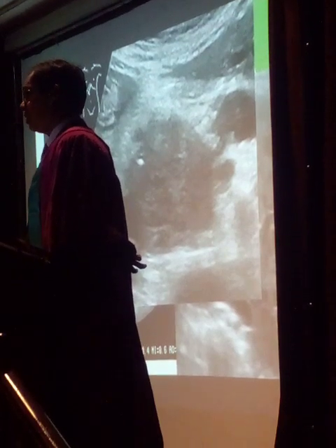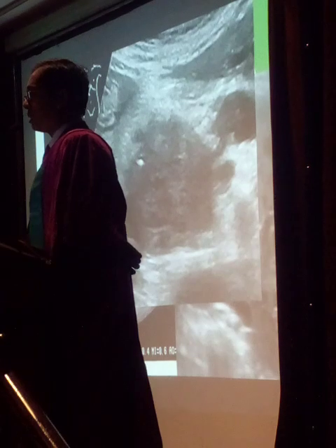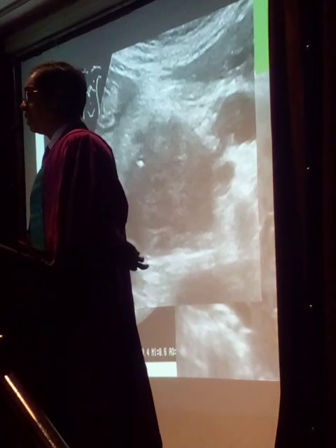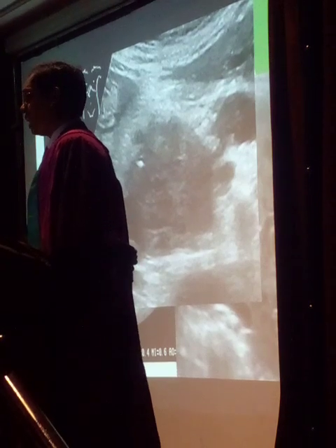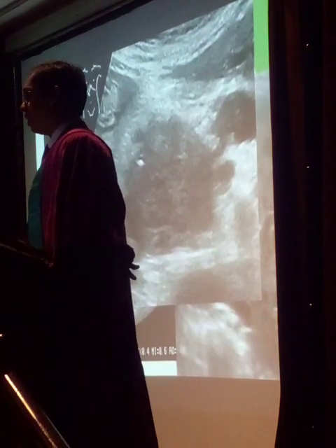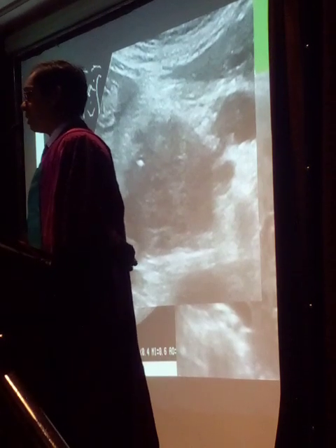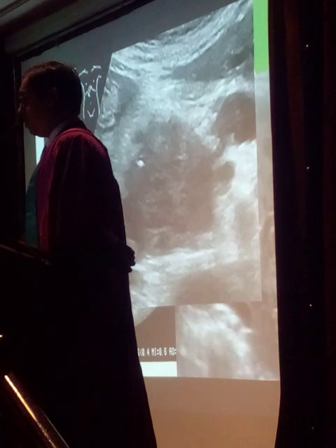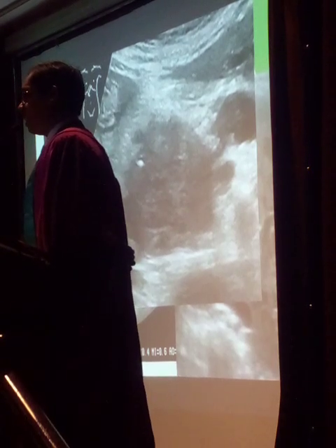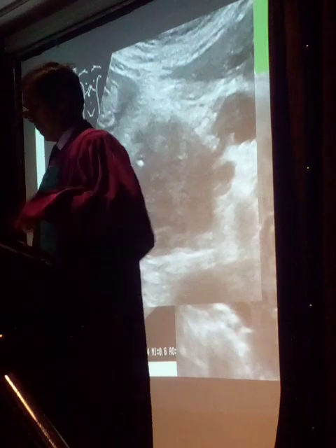So calcification is usually not there, but you can see it associated with other pancreatic pathologies. The margins are always very ill defined because it invades here and there into the surrounding structures, maybe blood vessels or duodenum, and cystic areas are seen if it is the mucinous type.